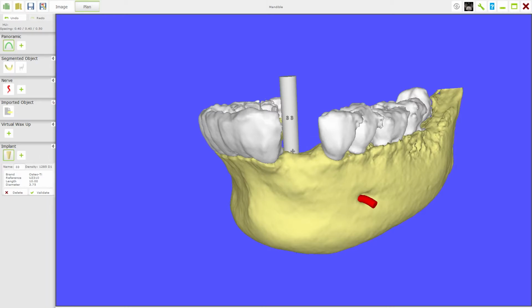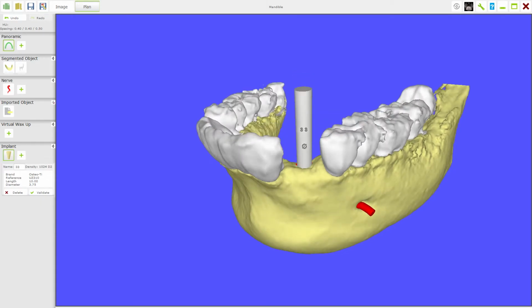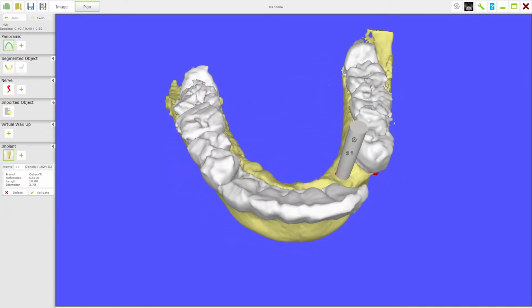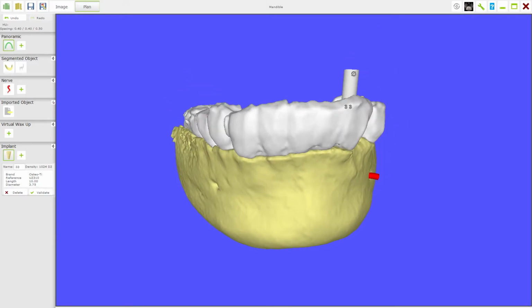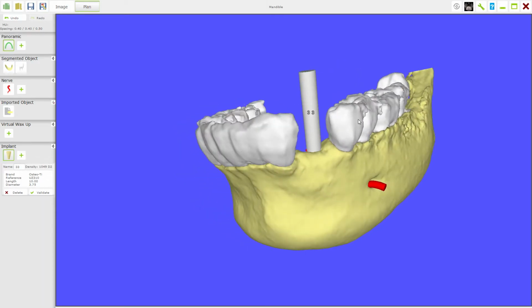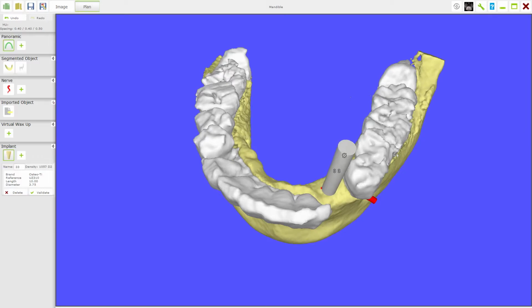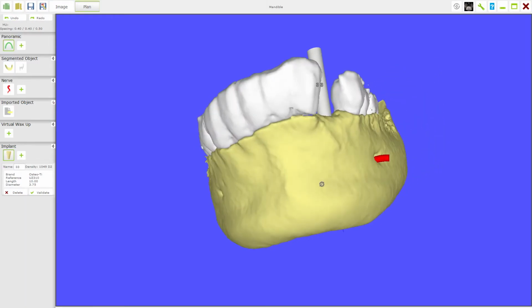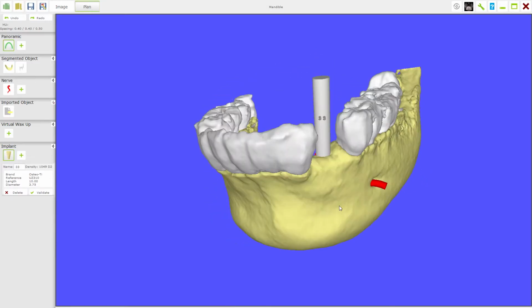can change the shape now to that little cross, move it distally. Look, I can pull the implant out of the bone, I can pop it back into the bone, and I'll just rotate it a little bit. Remember, when you get this circle with the little pointers on, I'm just right clicking the mouse to move it backwards and forwards, right click it, and we're beginning to see some improvement now. I might want to try and move it just a little bit this way if I can. See if I can get it a little bit more. And it's really just a matter of optimizing the positioning of that implant.